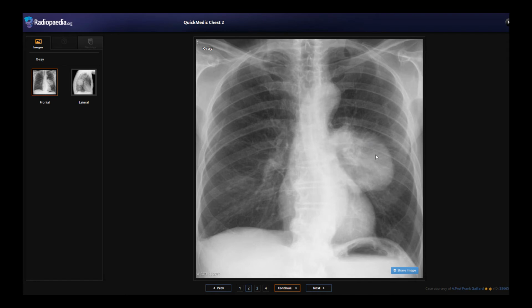There's something odd here, and that's within your lung fields, over the side of the heart. That looks abnormal. This side looks okay. There's a bit of chronic change here. That's all non-specific, but this looks abnormal to me. Looking at the display and exposure, there doesn't seem to be any rib fractures or anything obvious, no pneumothorax.